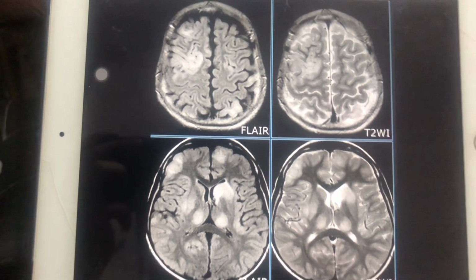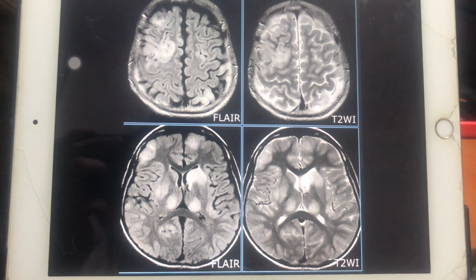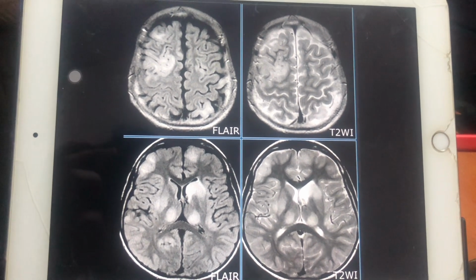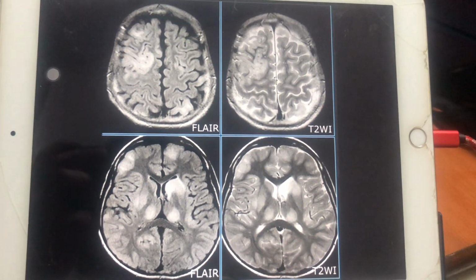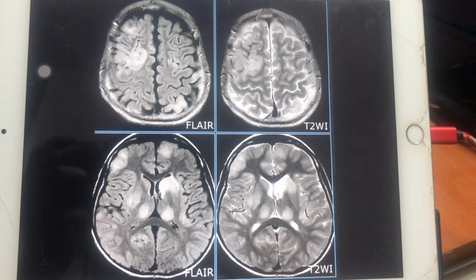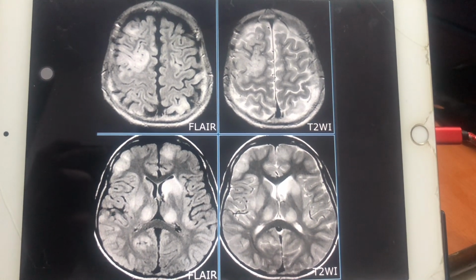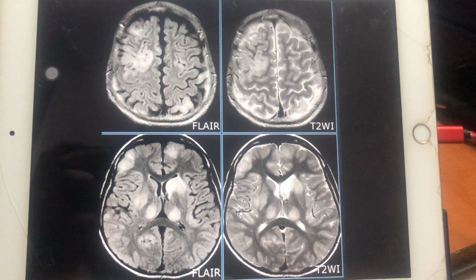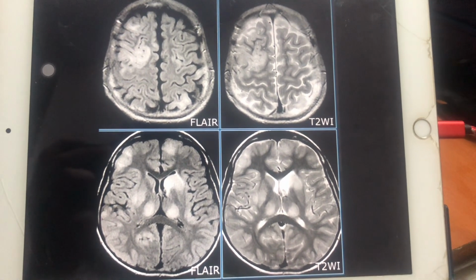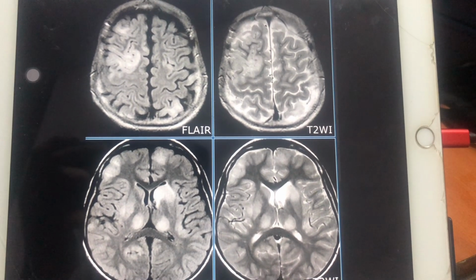So we discussed brain tumor versus tumefactive demyelination. Another condition that we must differentiate from MS is ADEM, acute disseminating encephalomyelitis. Right. So in the spinal cord, in ADEM we have a long segment involvement and it is fleeting, and it is usually seen in children post vaccination or in adults post some viral infection. The white matter lesions are fleeting, they disappear after a couple of months, and they are long segment, that is, more than 2 vertebral segments are involved.